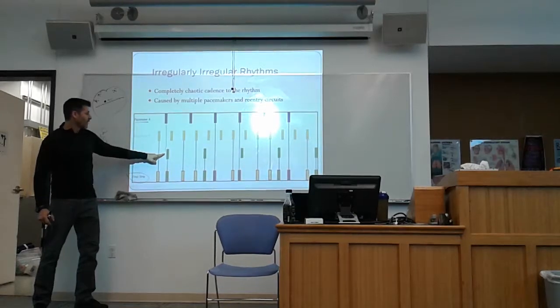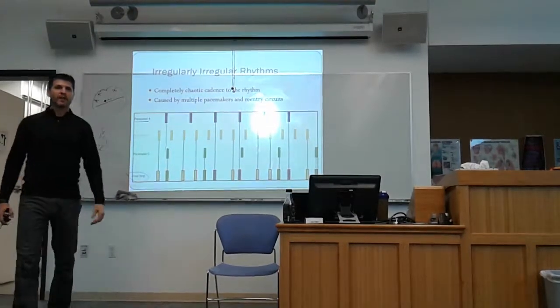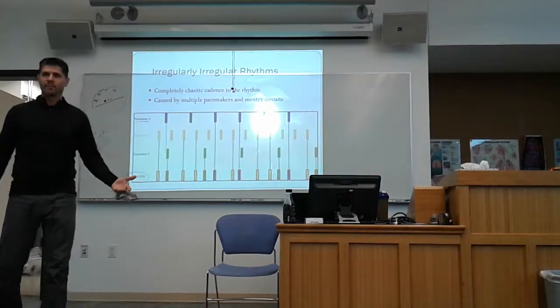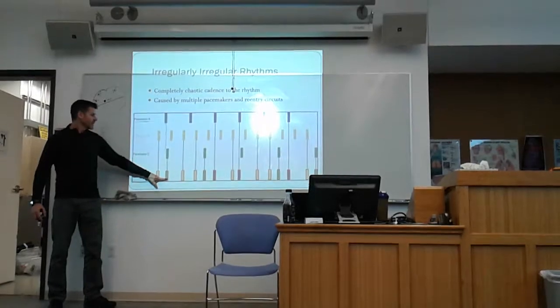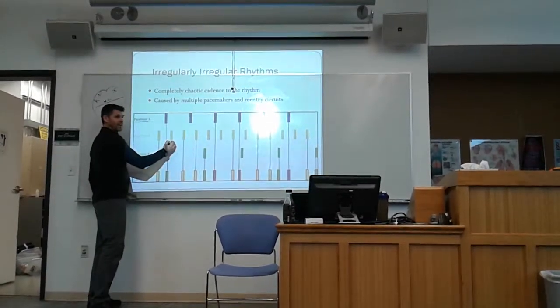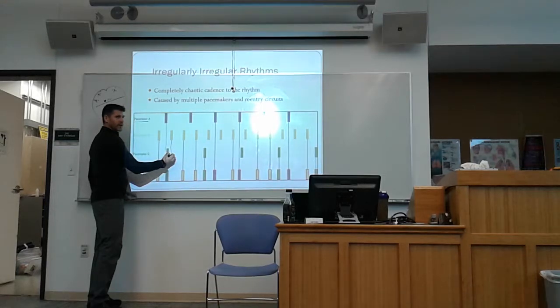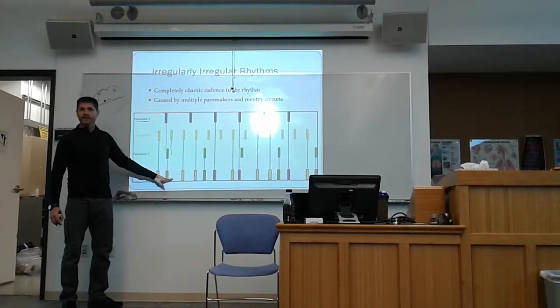Immediately after that, however, the green one fired, and the AV node was beyond its refractory period, so it could respond. So it paid attention to the green one. Now, right after it did that, that yellow one was sending its signal again, right? But what was the AV node? Refractory. It was refractory to it, so it couldn't respond to that signal.